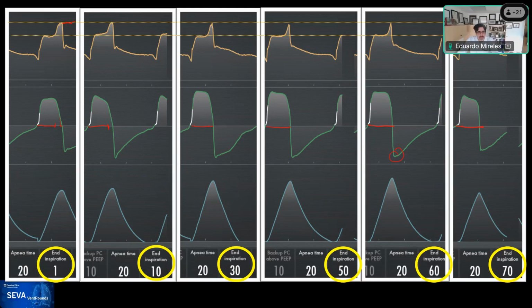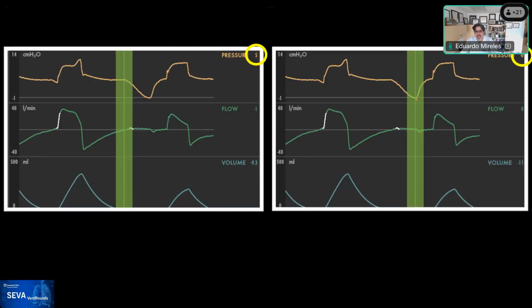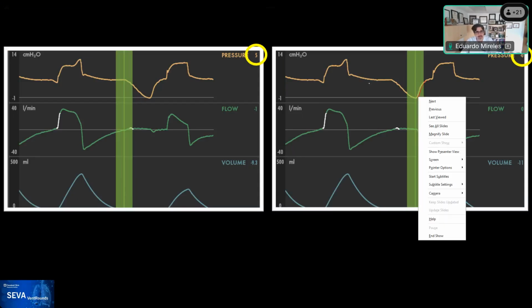So this is what we're seeing, right? Remember, this is the waveform for your Pmus. The patient is relaxing and then it rapidly comes down, and that's the peak that I'm seeing over here. Without a doubt, it fits very nicely on this image from the white line to the dark line. This is the delay on the system to stop. That's what you're saying, right, Roberto? So it has to do with the actual output. I didn't understand what you just said. That the breath ended up right here at this peak. Oh, yes. And so all of this time from here to here is what would be a late cycle, technically.